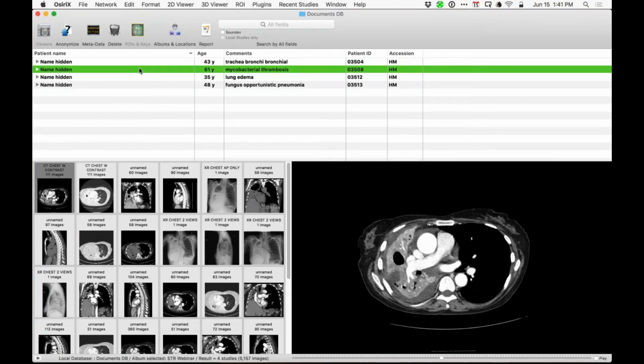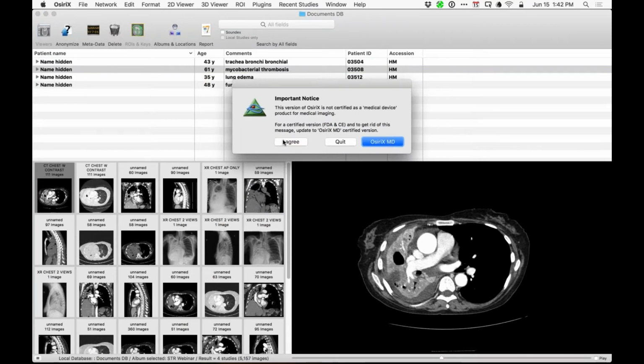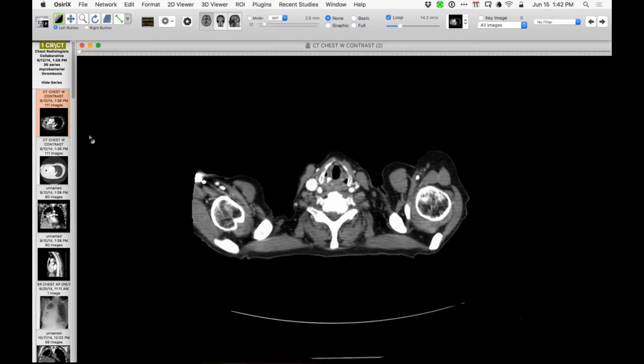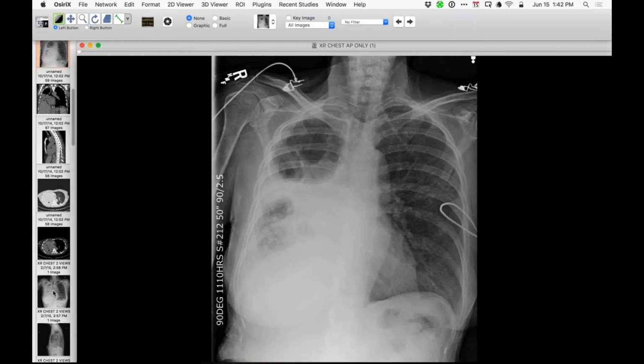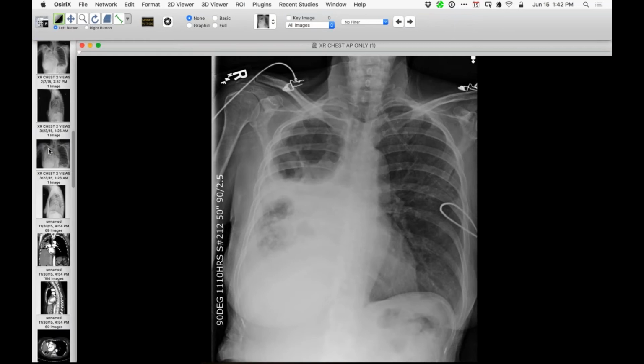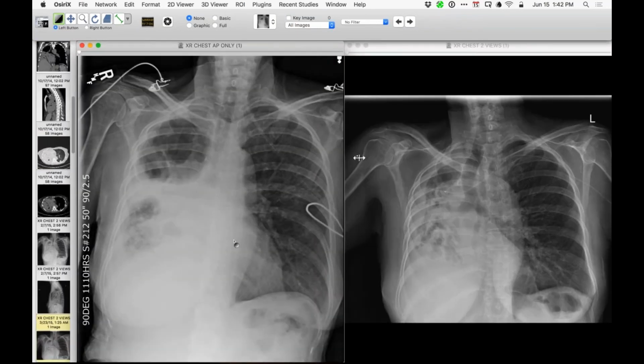Okay, let me show you this interesting case. Just for context, I will tell you this person has tuberculosis, and I'll show you a radiograph from 2014 compared to 2015. You can see that over time, that right lung is just kind of disappearing. You can see the evolution of extensive bronchiectasis within that lung as the lung parenchyma disappears. And there's also some pleural disease.